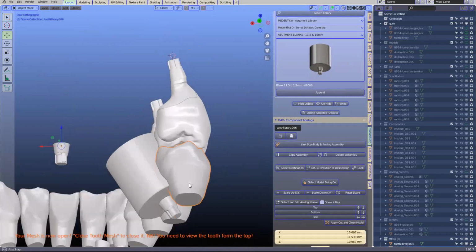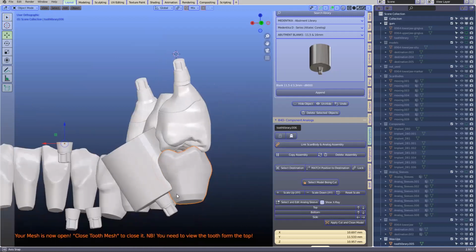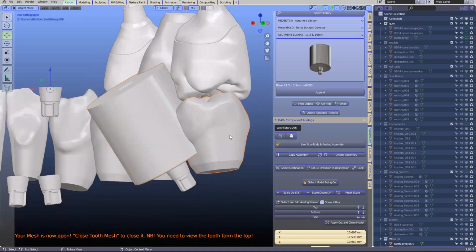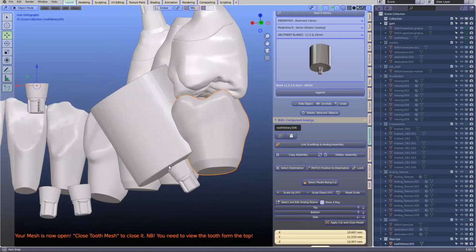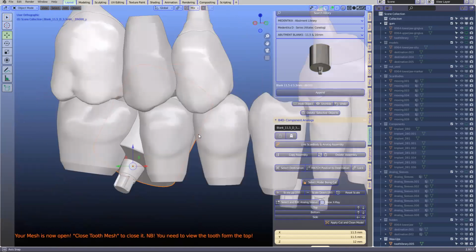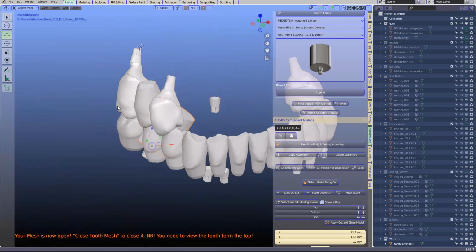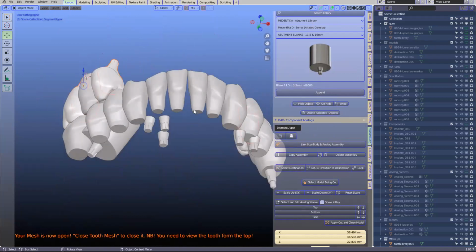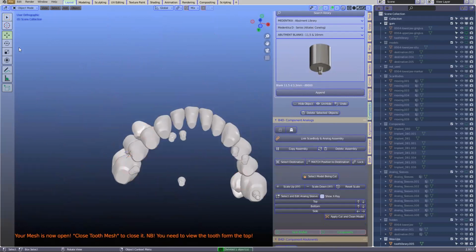So once we connected that up, this is really tricky, this case, because you can see the blank where that is, and you can see where this tooth is. So we need to pull this all the way across in order to make this abutment. But I think we'll leave it here, and that will be part of the tutorials we can do some other day. Maybe part 2, can you maybe do another session to finish it? Or is that next time?